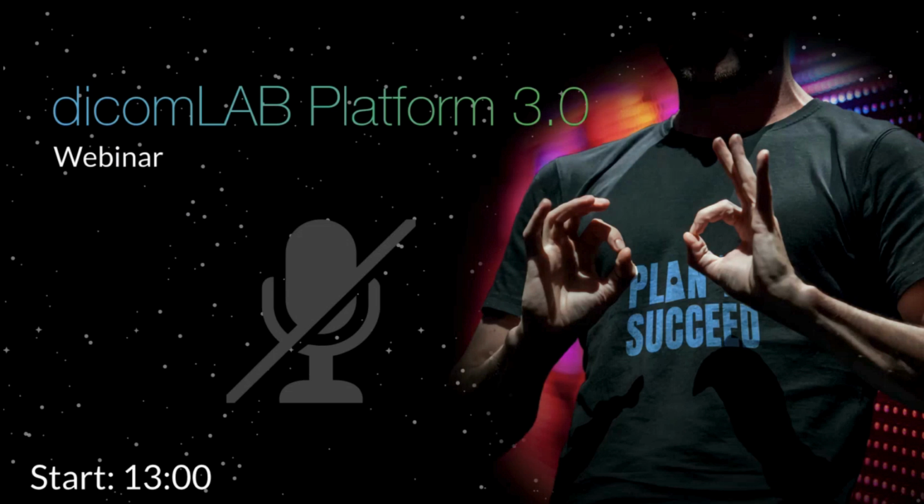For those who were using our previous generation of the system, it's going to be a major change, since the new software is now opening up in the cloud environment. And I'm going to show you some details and all specifications of this software.